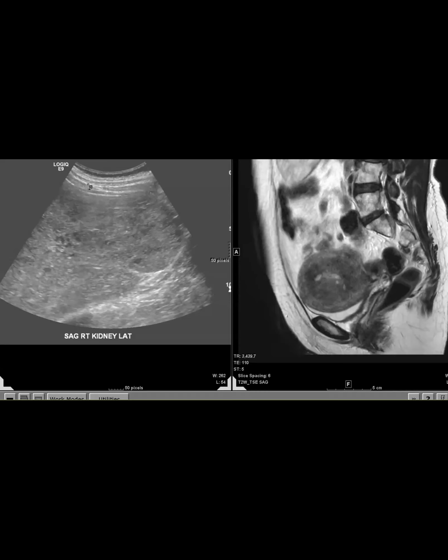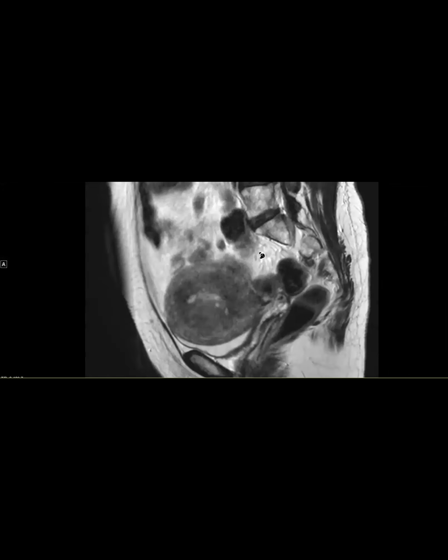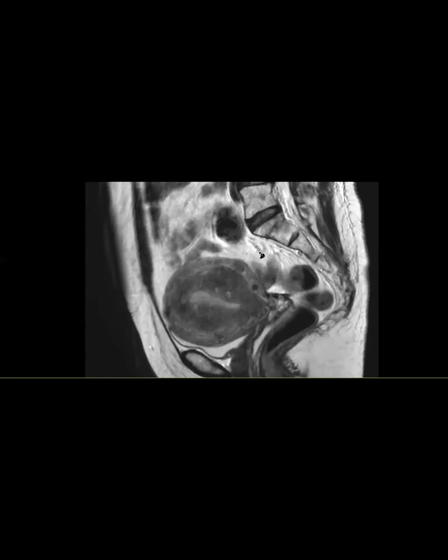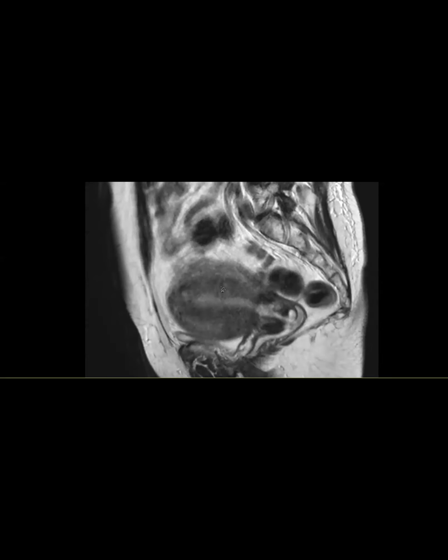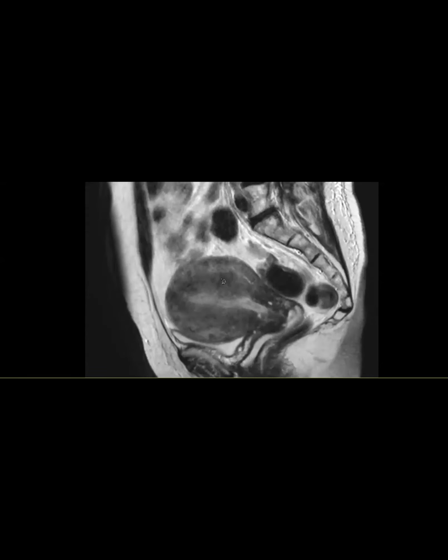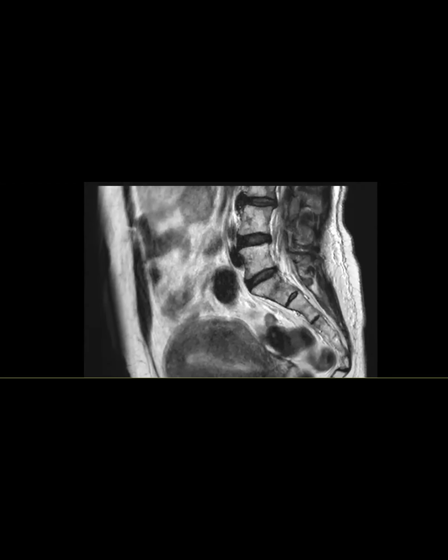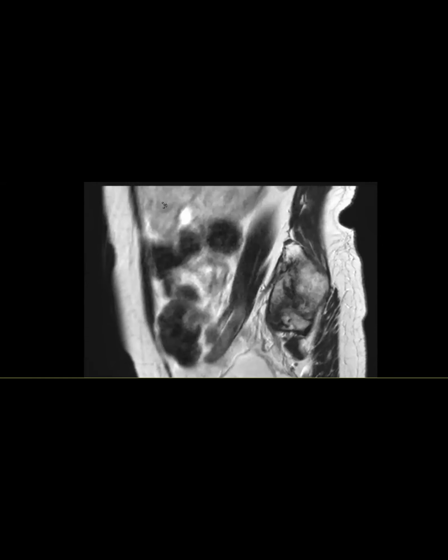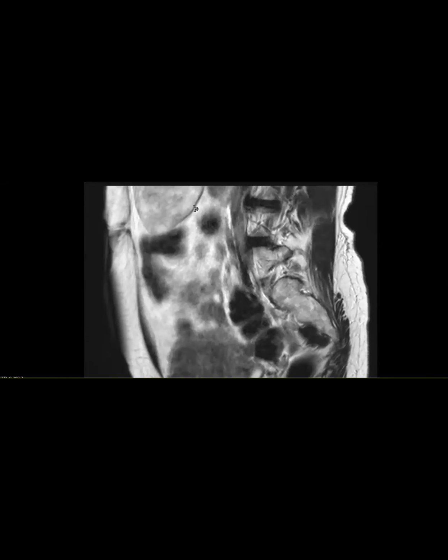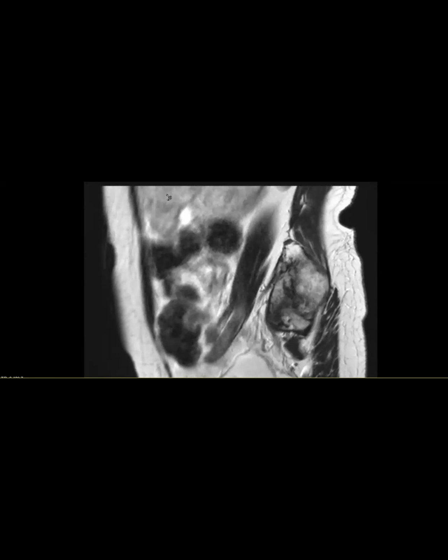Okay, so here, I'm taking that out. So from here on, you can remove the, okay. So this patient actually came in for evaluation of her adenomyosis. They were looking to do either embolization or something else. And incidentally, we saw that her liver was not normal. You can see here, there's just a piece of liver that has a very abnormal appearance.